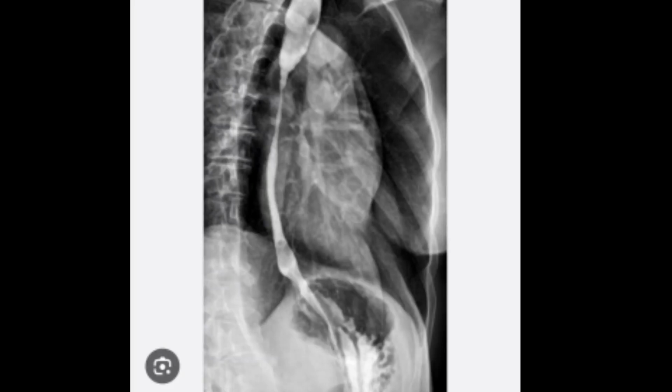But soon after that, you will see that the mid and lower esophagus are showing stricture formation, but a smooth wall stricture. At the distal end there is a radiolucent patch. This is because of the ulceration, and this is a peptic ulcer. Peptic ulcer is an inflammatory type which results in smooth wall esophageal stricture.